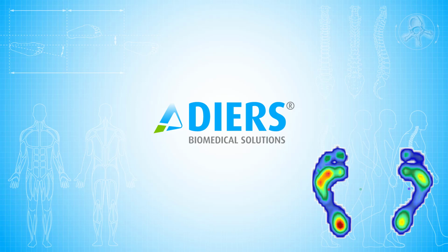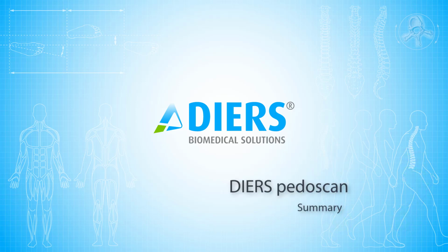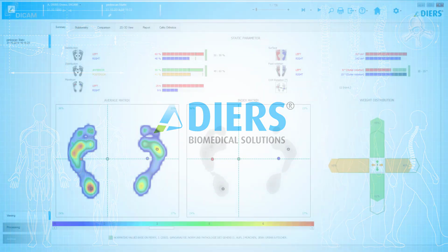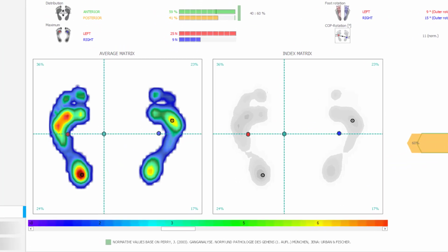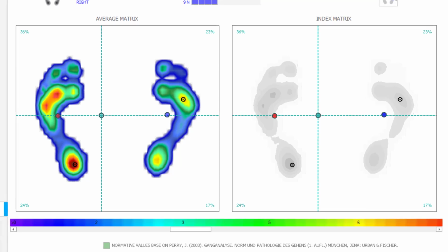Now, let's dig a bit deeper into the results display of a static foot pressure measurement. The significance of the result pages is divided into three primary focus points. First, the subjective pressure image that the feet project onto the floor, possible as a still image of the average pressure or as a time progression. This can often be used to identify a conspicuous foot position.